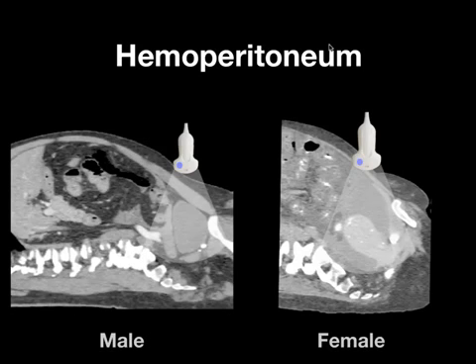Using sagittal CT images, you can see how a positive image is going to appear. Here you've got a male, so you've got the indicator towards the patient's head. Here's the urinary bladder. Back here will be prostate and seminal vesicles. And here you can see the free fluid. Here's bowel right here, and this abuts up against the bladder and goes into the cul-de-sac.